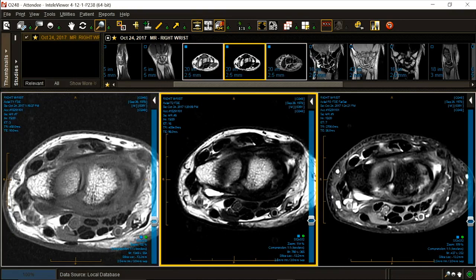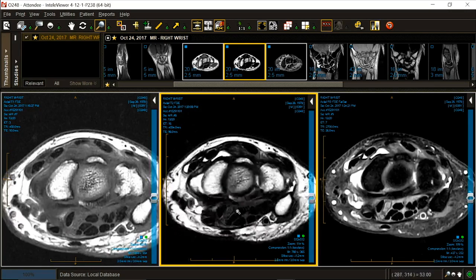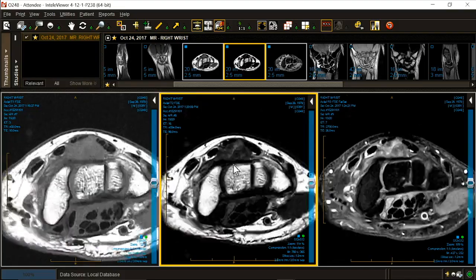And while you're scrolling, they were worried about a ganglion. There is one. The two most common positions for a ganglion are directly over the scapholunate capsule. There's probably one right there. A ganglion is simply diffusion of proteinaceous material from the joint through the capsule. It goes through the meniscus. It's a parameniscal pseudocyst. If it goes through the capsule, it's a ganglion pseudocyst. Exactly the same pathology.